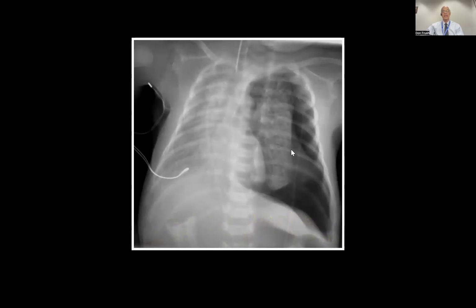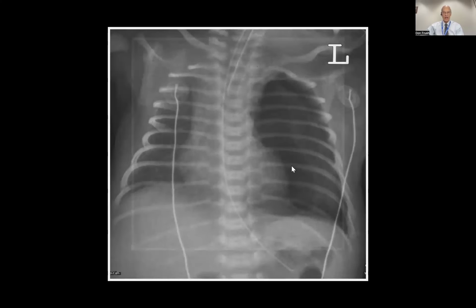Now, if we see this case here, this is much more clearly a pneumothorax. Large lucent area, no markings here. See, there's a depression of the hemidiaphragm here. The child's intubated, so this is a tension pneumothorax because they're on positive pressure ventilation. This has not only resulted in a large air collection outside here, but see, it shifted the heart and the mediastinum over to the right, causing some parenchymal opacification here. So this is certainly an emergent situation which would require a thoracostomy tube.